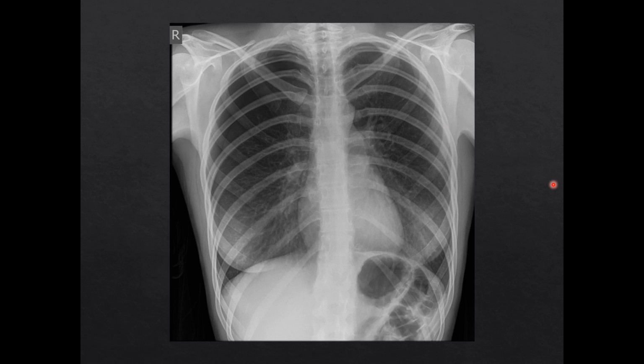If the lung markings denote that what you're looking at is lung tissue, and the definition of a pneumothorax is air surrounding that lung tissue, air within that pleural cavity that should just be a very thin layer of fluid, then that's how you distinguish between the two. That thin layer with the edge of the lung with no lung markings crossing it.